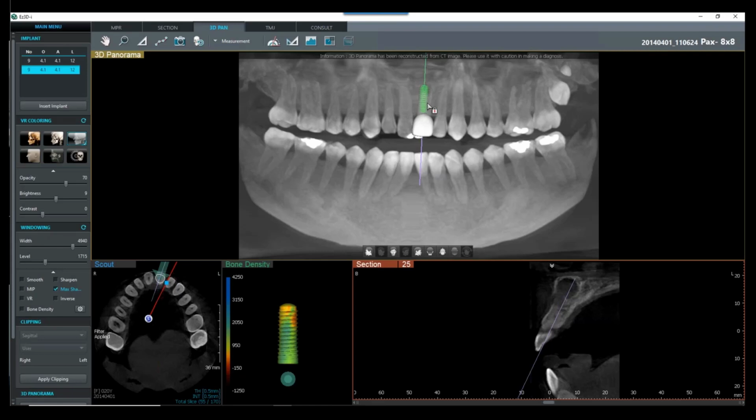So you can right click, and you can see there's a padlock displaying when we try to click on it. To lock it or unlock it, basically just right click on it, and see, now we can unlock it. So there, perfect.